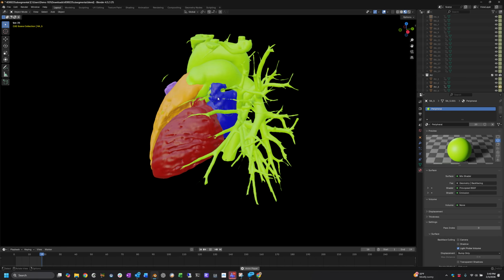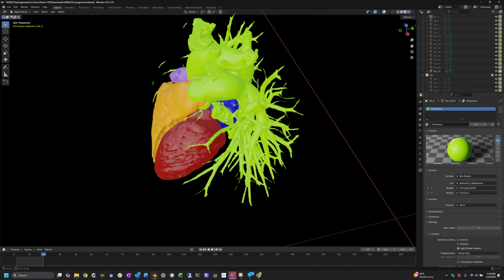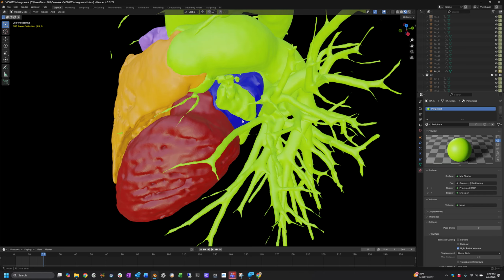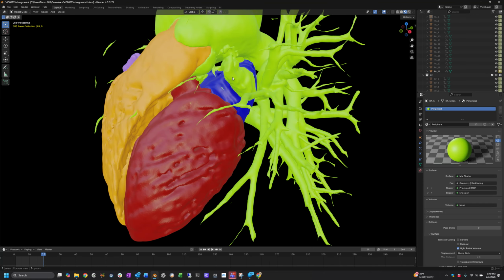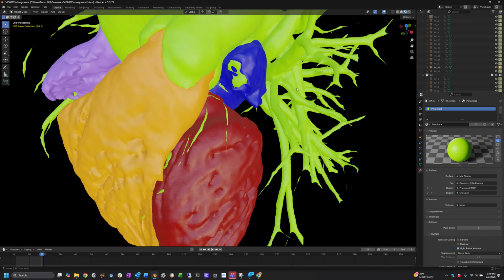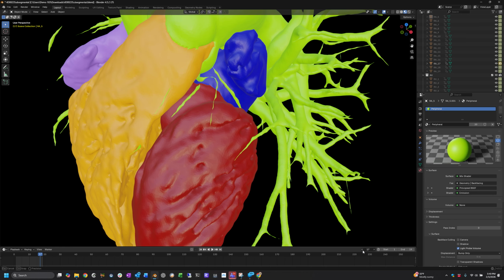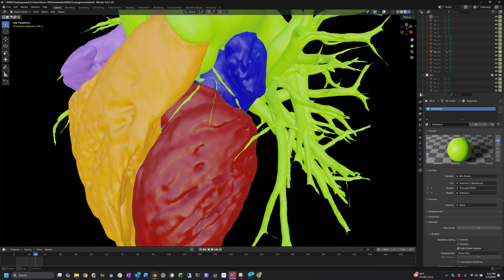The other part that required analysis here is the left atrial appendage. When I was first looking at it, it had been identified as pulmonary veins as opposed to the atrial appendage. So if you can see that, see how the appendage was cut off on 19 and 20. And there, I don't know why that snuck through, but as you go through, again, here's 14.